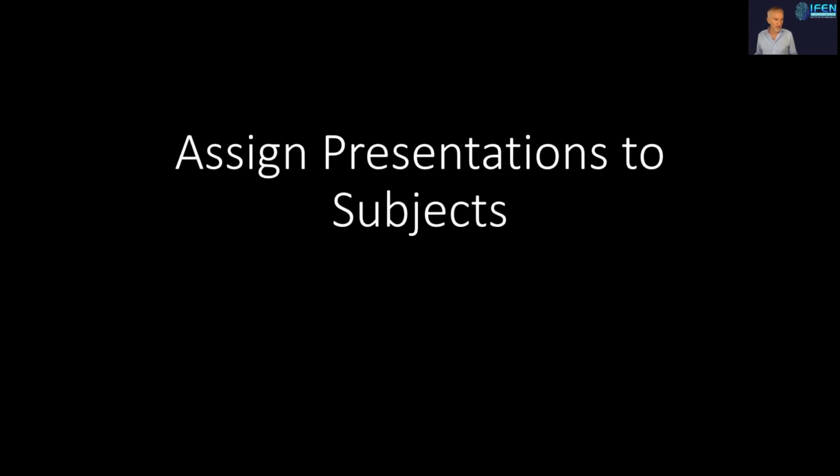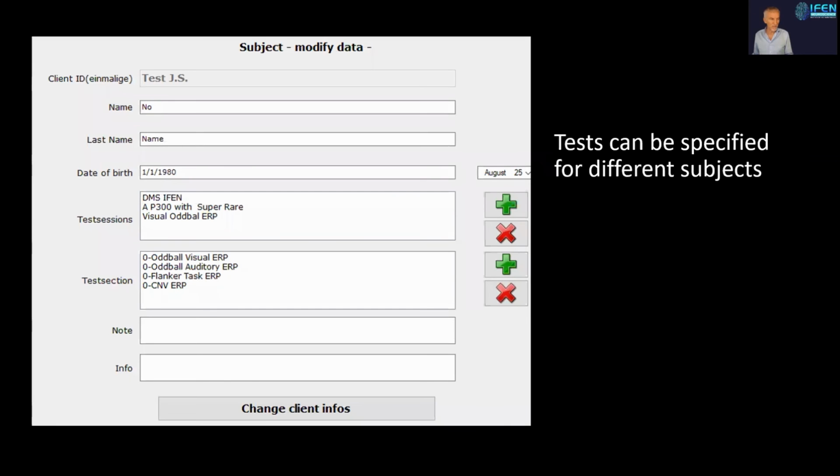And of course, you can assign presentations to subjects, to several subjects, which is also a possibility inside the software, where you can define a subject name or create a subject folder in which you can add other stimulus presentation protocols.